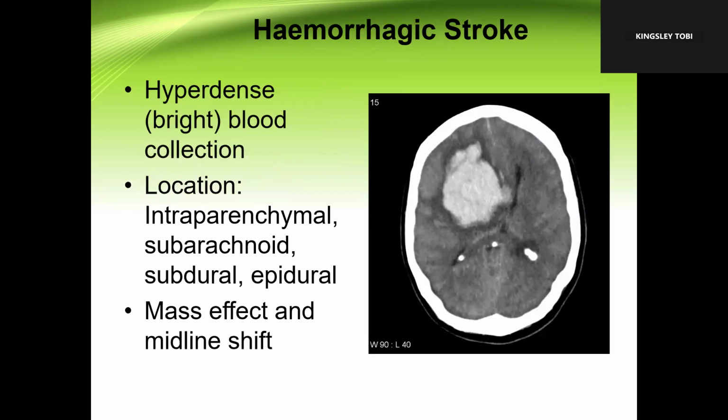So look at hemorrhagic stroke here, all right? Compare with the last one we saw. You can see this hyperdense lesion. This is blood, all right?